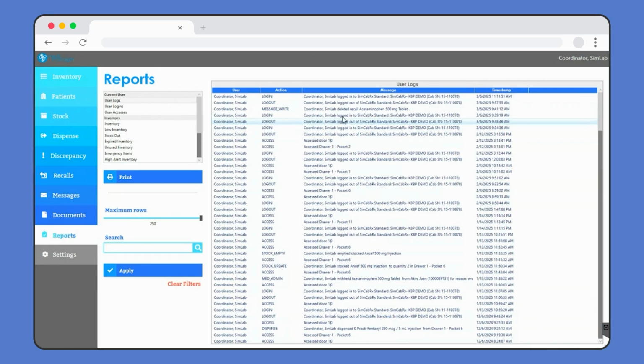In some instances, they can do so. There is a print button associated with the reports page and others within the MedsManager software. The school or organization utilizing the KbPort MDS products will need to have their IT department map a printer of their choice in their location in the lab area to the medication cart or cabinet device they're working with in order for printing to be enabled. So this occurs in the lab environment.